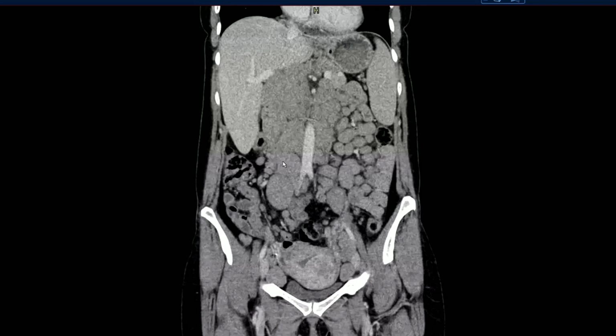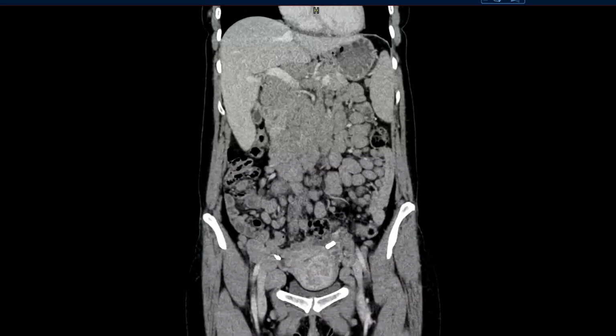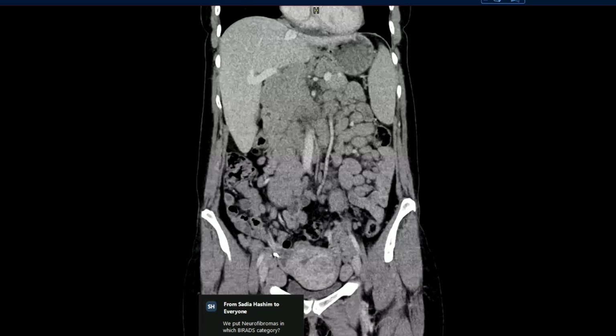It's not a breast cancer. So now you remove that BI-RADS from there. So when I did the post biopsy read, I put it to BI-RADS 2. I said she has lymphoma and nothing in the breast. So then you bring it back. But if you see abnormal lymph nodes, you put it to BI-RADS 4C, you biopsy it, it comes as a breast cancer, then you put it to BI-RADS 6, biopsy proven cancer. Okay. So for lymph nodes, this is how you do it.